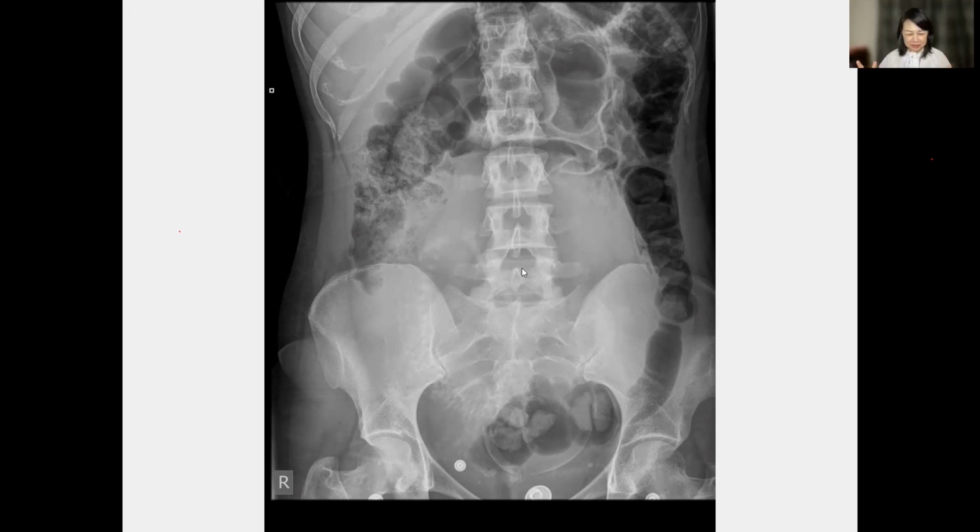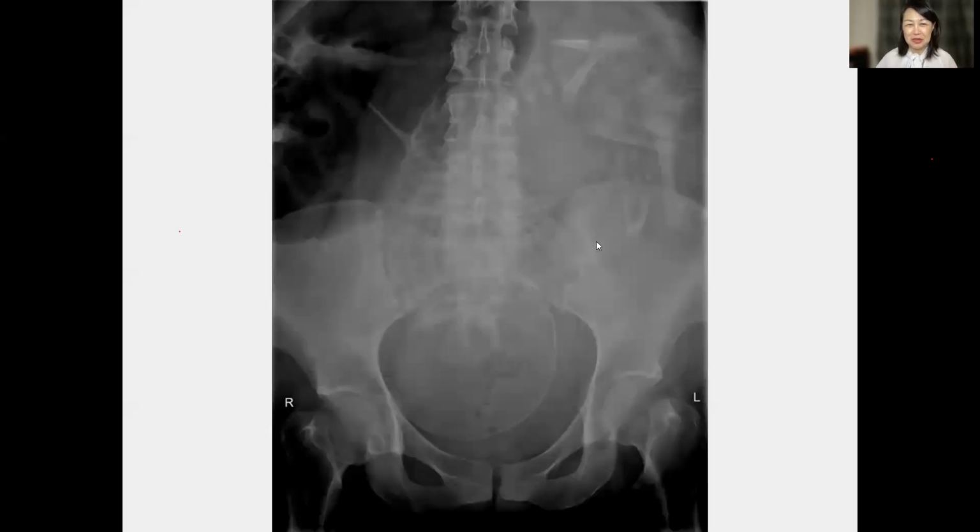Very interesting lecture, I enjoyed it a lot. So this is another fetus. This is even bigger, third trimester already. You can see this is already coming out, and I think the os is open. This is scary. This is a fetus.